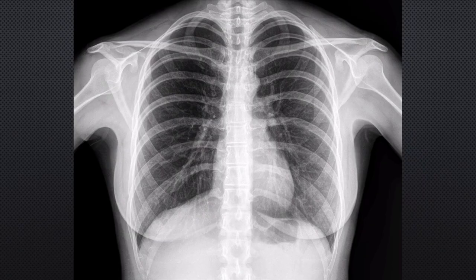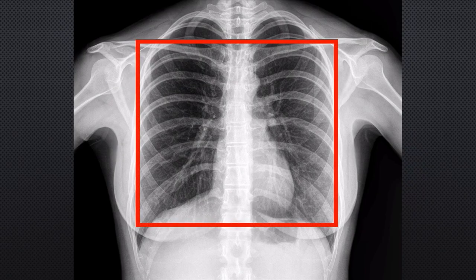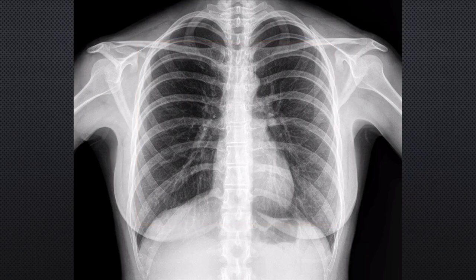Continuing in the central chest, but moving outward, we see the pulmonary vascular markings starting at the hila and branching into the lung fields bilaterally. You'll remember that the lungs are very highly vascularized, and there is a robust network of vessels extending into the lungs from the central portion of the chest. Moving peripherally from the central chest, note the pulmonary vascular markings around the hila, branching and tapering as the vessels extend laterally throughout the chest.